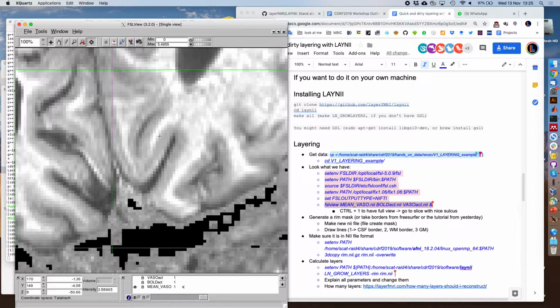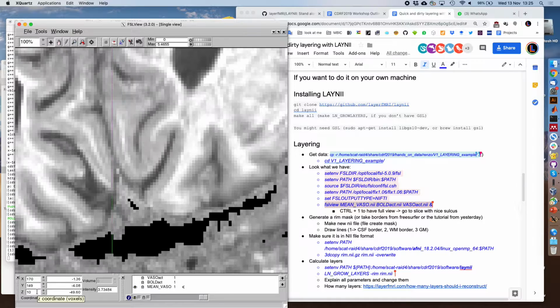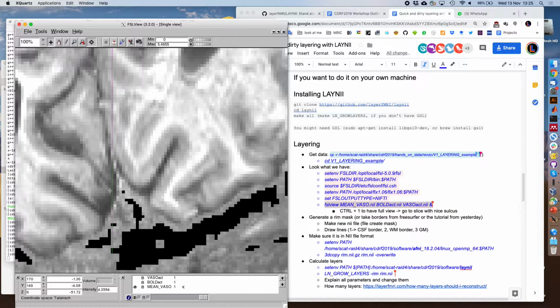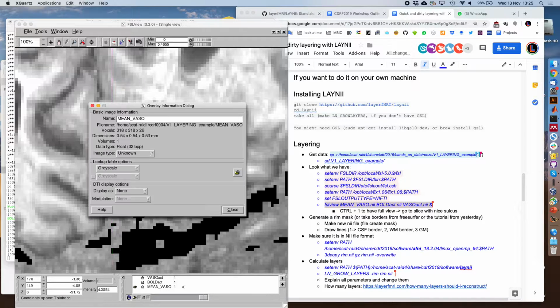So here this looks to me something like the calcarine sulcus. If you want to see it, you might see that there's something like an indication of stria of Gennari, like we have brighter voxels. Like this is obviously CSF, the black stuff. Then we have brighter voxels, which would be layer 2, 3. Maybe a line of darker voxels, which might be the stria of Gennari, and then the brighter one, which would be white matter. We can zoom a bit through it, so we are not perfectly perpendicular. We don't need to be, because it's almost isotropic voxel sizes. In fact, I believe the slice thickness was even smaller than the in-plane resolution, as you can see.